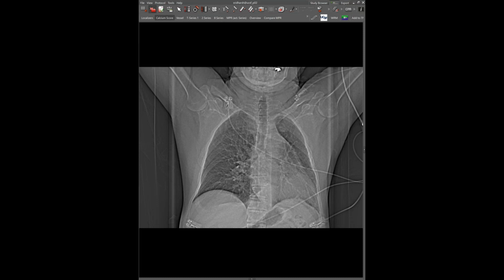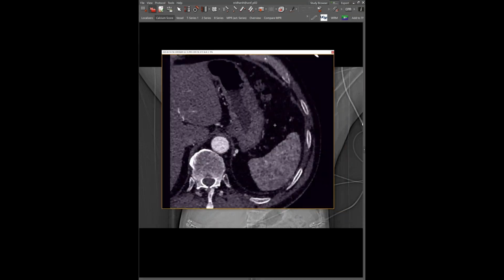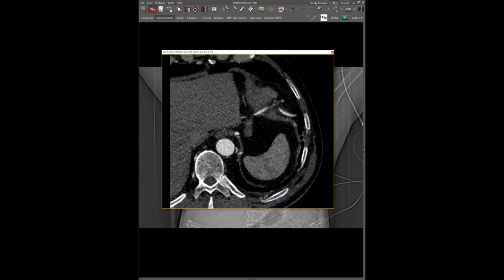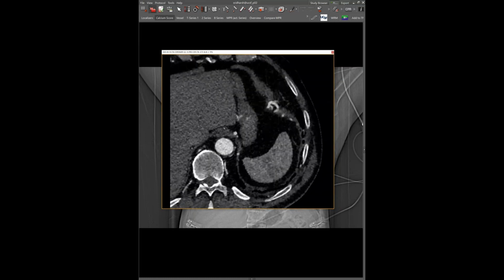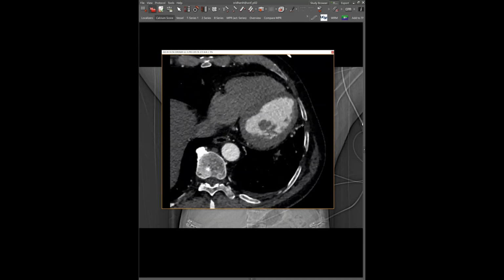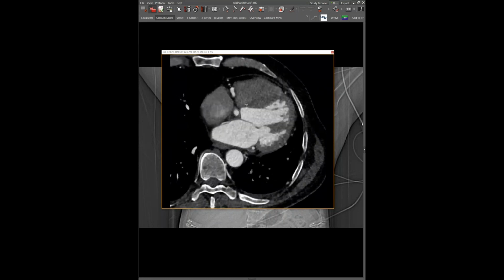And we take a look at his coronary CTA. As we come up here, notice there's a fairly large vessel coursing along the undersurface of the left hemidiaphragm, and then there's some branches that are going along the left aspect of the heart. And we keep coming farther up. I'll ask you to take a look at the RCA. We have some interesting anatomy here.